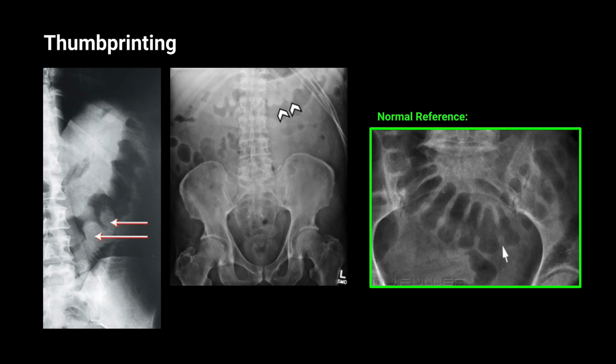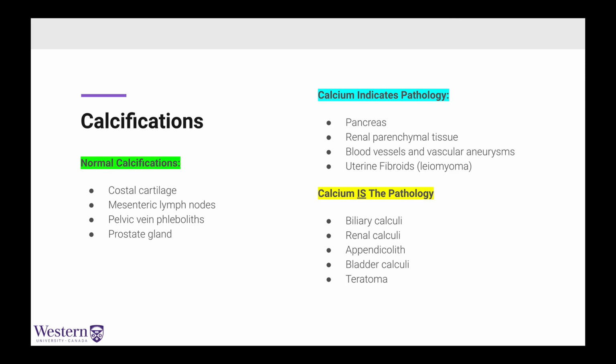Finally, with respect to calcifications, it's important to understand that there are normal calcifications that you expect to see within the abdomen.